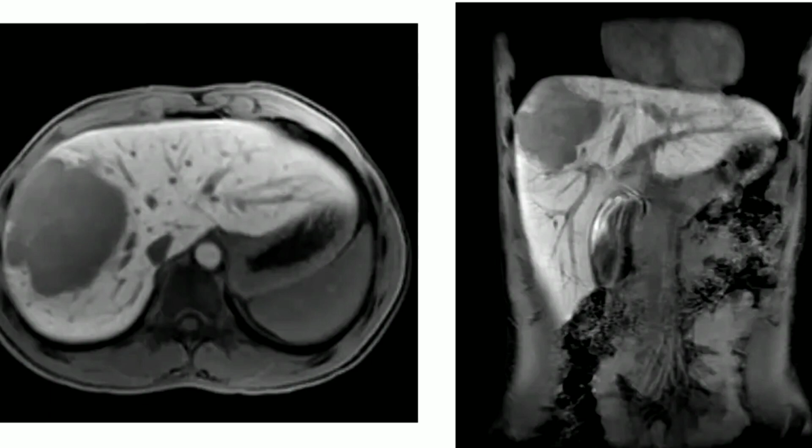Excellent. Yes, ma'am. If I brought you these images without saying, you can readily tell me that these are 15 or 20 minutes delayed Primovist or Eovist contrast or any hepatocellular agent. What is the idea of Primovist or Eovist? It's a hepatocellular agent, a type of contrast that is taken up by hepatocytes. Any cell that is a hepatocyte will take up this contrast. How do we know? We will see that the liver lights up in the study, as we can see here. This is coronal, this is axial.